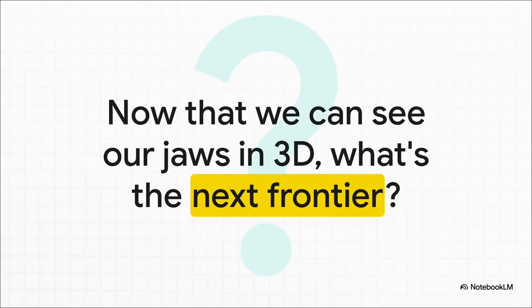From a simple bite wing to a full 3D reconstruction, you can see dental imaging has come an unbelievably long way. It really makes you wonder, doesn't it? Now that we can literally fly through our own jaws in 3D, what's going to be the next frontier in how we see inside the human body?